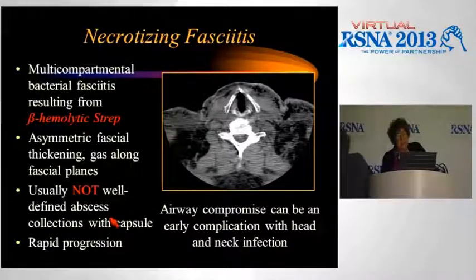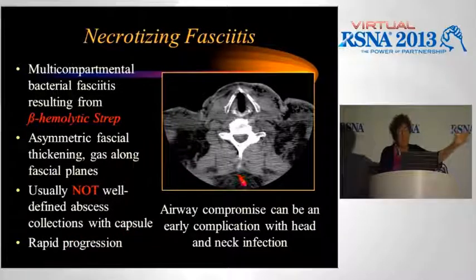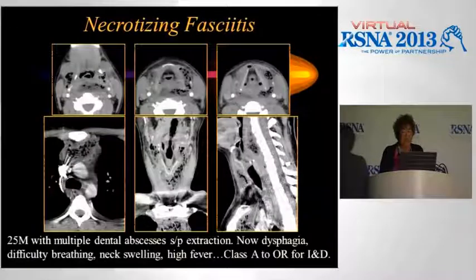It's not a well-defined abscess with a capsule. It kind of goes everywhere. It's multispatial. And airway compromise can be an early complication with head and neck infection.